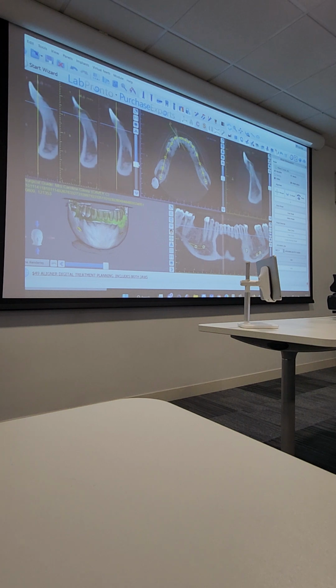If you've got gold metallic crowns and porcelain bonded and everything, don't worry too much about it because of the beam hardening and everything. You're not going to get the accuracy. Check the accuracy there. It's not the right position, so always find just natural teeth.